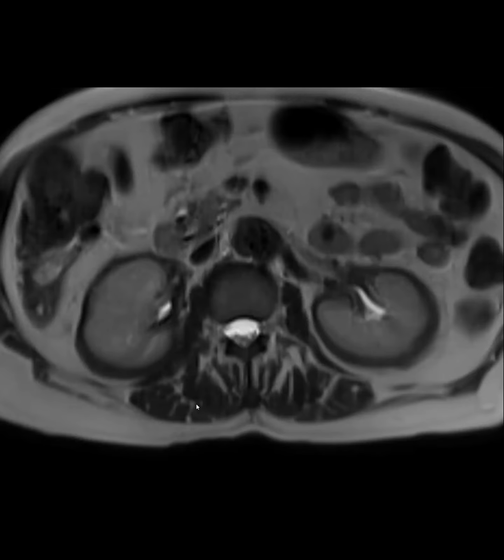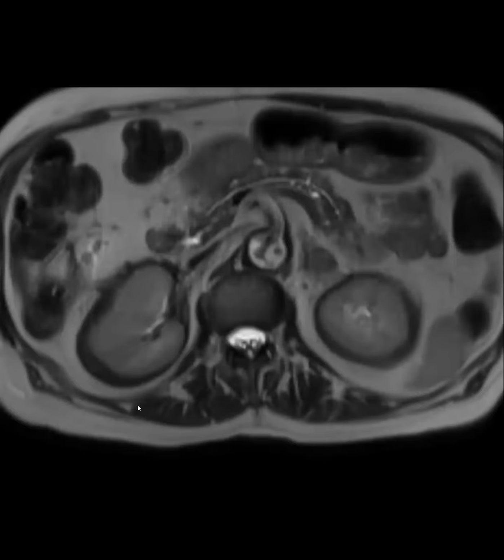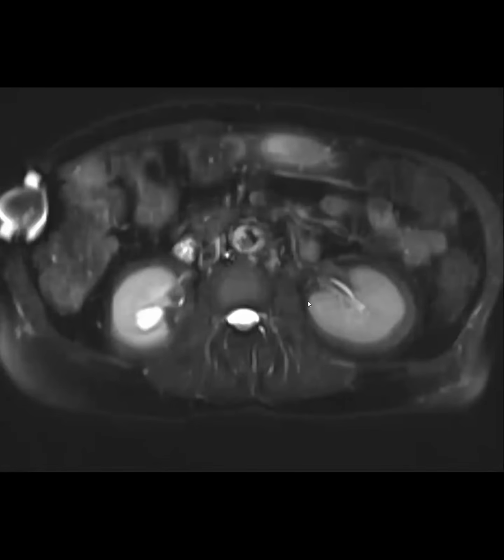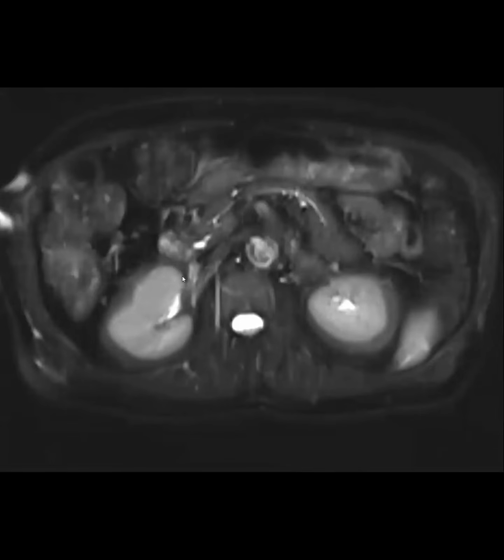And then they also had this new pain and they were thinking there might be giant cell arteritis. But anyway, they have known IgG4 disease and they've been on years of treatment with both steroids and rituximab. In the acute phase, you can get perinephric disease. So renal IgG4 in the kidneys can be focal deposits with multiple hypoenhancing masses, but it can also just be perinephric. In the more acute phase, it'll be more inflammatory, right? But here we can see that it's just that super T2 dark without a lot of inflammation. The fat around it is really pretty good. So this is just treated, fibrotic IgG4.